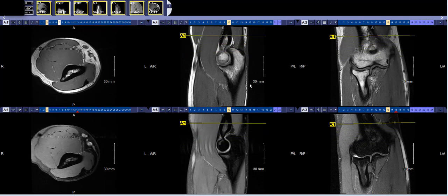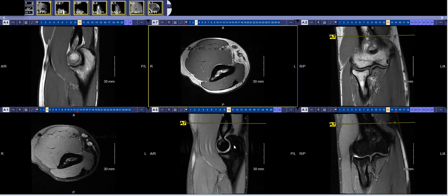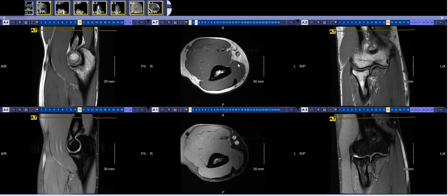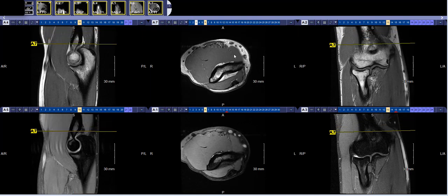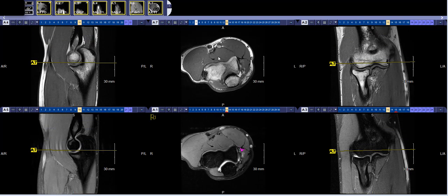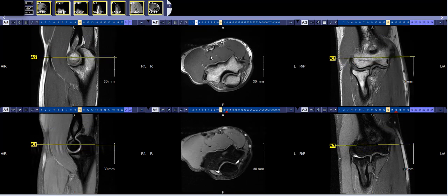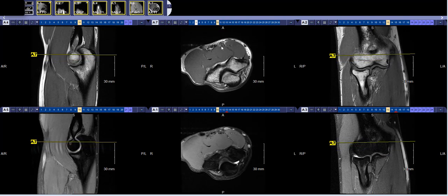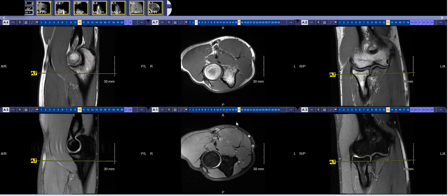And so my typical search pattern starts with the biceps tendon and the triceps brachii, the triceps tendon. I start with the biceps. The T1 is very helpful for just finding anatomy if you're having a hard time finding or characterizing anatomy. So I find the biceps, which is going to be anteriorly here, and it's going to follow the brachialis muscle into the antecubital fossa here. So here's our biceps coming down.